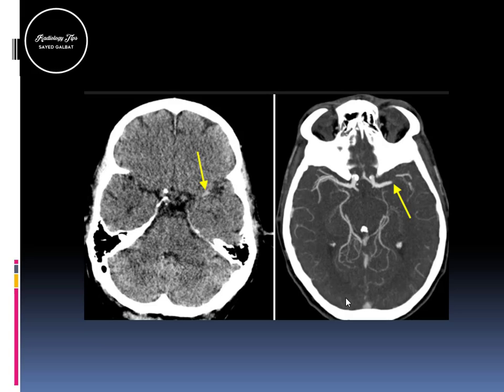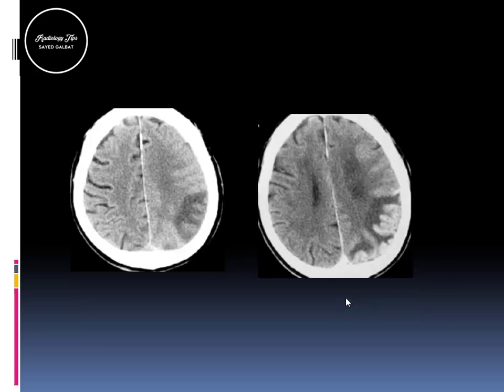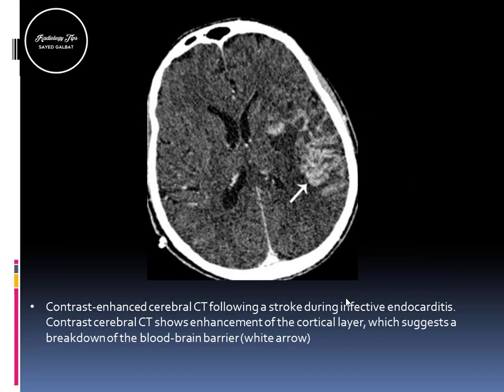But actually, you said that the delayed phase showing the classic gyral pattern of enhancement didn't add anything to your diagnosis. You wouldn't change your diagnosis from infarction to cerebritis, for example, based on this contrast enhancement. This is another pattern of enhancement, thick gyral pattern with some edema.